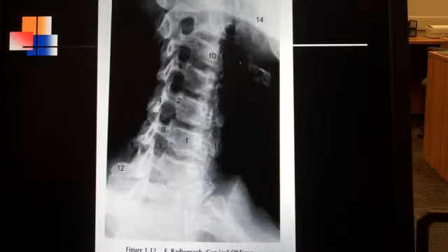As we get started, number one is on the vertebral body, and so all of this, of course, is the vertebral body. Number two is labeling the transverse process, which is coming across right here. Remember that it is a trough-like shape, and so you're looking at this one on end, and that is the transverse process. Number three is labeling the pedicle.